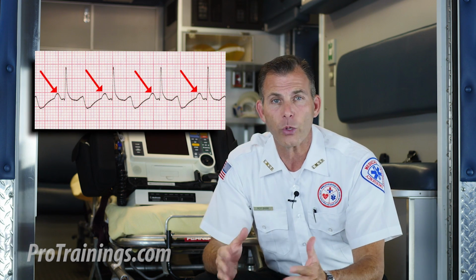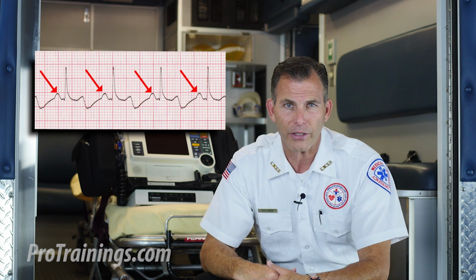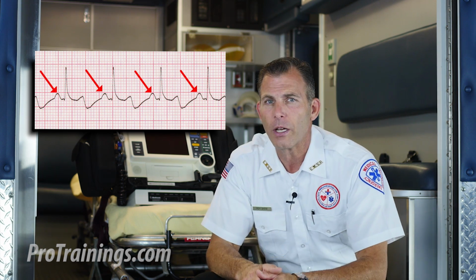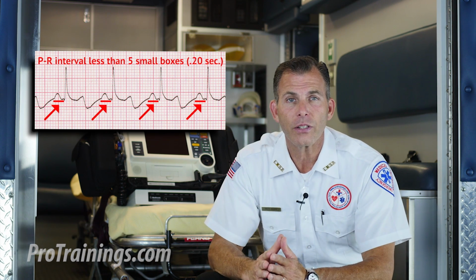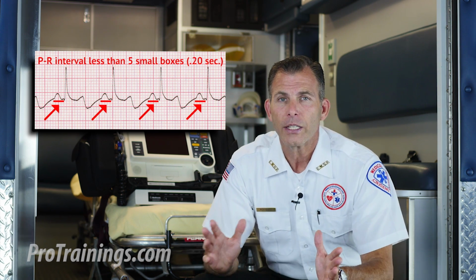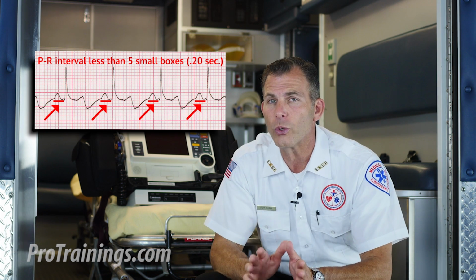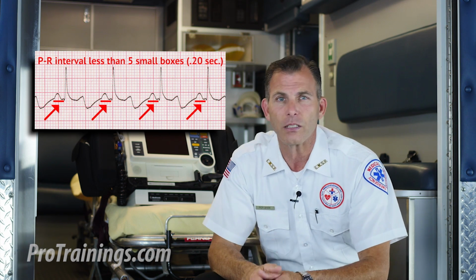Next, we look at the P wave. Are they present? Do they occur regularly? Is there one P wave for each QRS complex? Are the P waves smooth, rounded, and upright? Do all P waves have similar shapes? Next, the PR interval. Does the PR interval fall within the norm of 0.12 to 0.20 seconds? Is the PR interval constant?